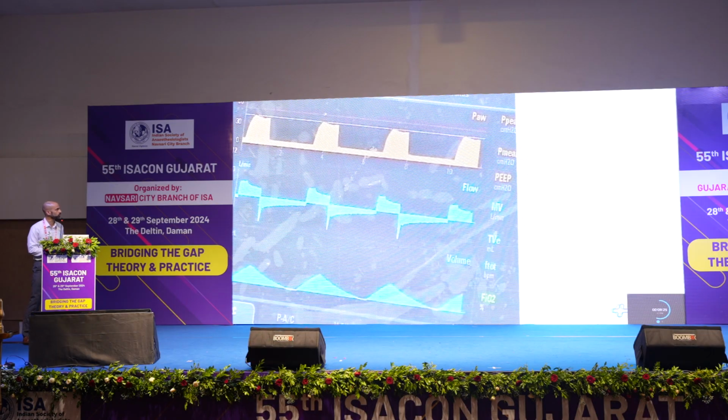What's this? Is this pressure control or volume control? This is a Mindray ventilator, and on the Mindray it will tell you that it's volume control, but actually this is pressure control, which is why I said train yourself on the graph, not on the manufacturer derived mode. This is pressure control. What is the load?